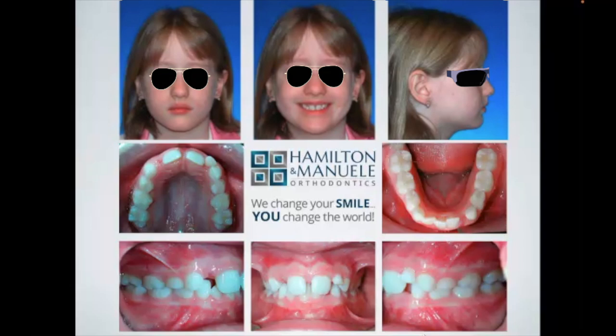Okay, so you're going to change the width of the maxilla. Again, we'll go through how we measure these out. We went through that last time. You could actually measure it on a cone beam, but just eyeballing it, you can definitely see, okay, well, aesthetically that would improve things. From a crowding standpoint, that would help things, right? We have more room there. And not only would it help on the upper jaw, which we noted had mild crowding, but how would that potentially help with the lower teeth?